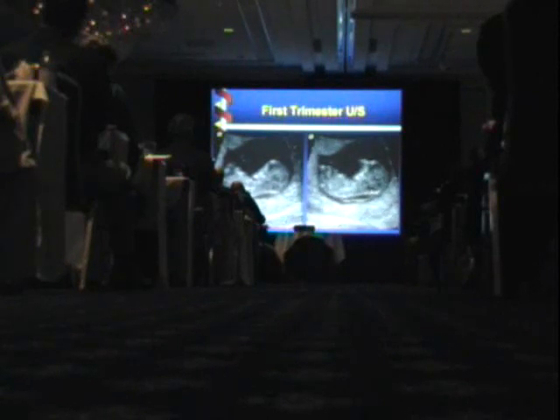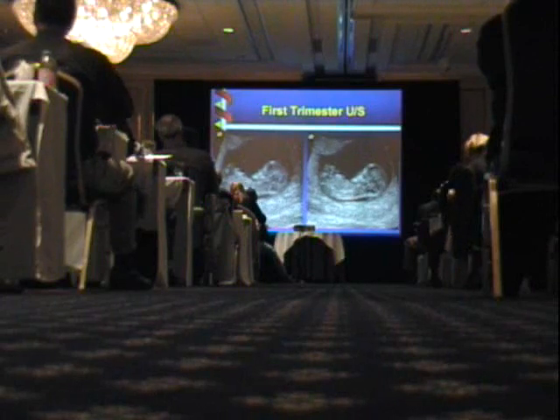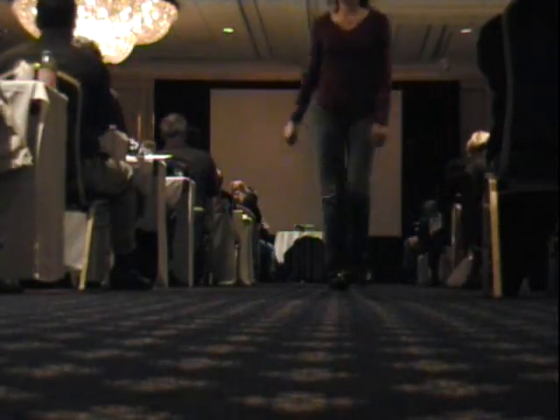I've come to the end of a whirlwind tour of measurements in the first trimester. I certainly hope it's been useful to you. Thank you for your attention.